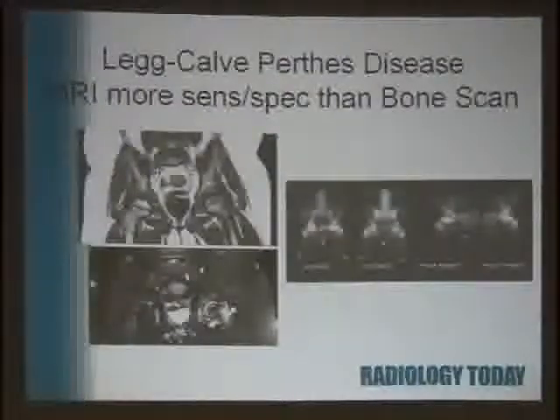Now here, I love MRI for this. Once we get that concerning plain film, we'll get an MRI. It's much more sensitive, and lets you be very specific. Here you see the sequence where the signal is bright fluid, like here's the bladder, bright. You see fluid in that little fissure. At the same time, we're trying to look on a bone scan. What you're looking for is a little area where there isn't perfusion.